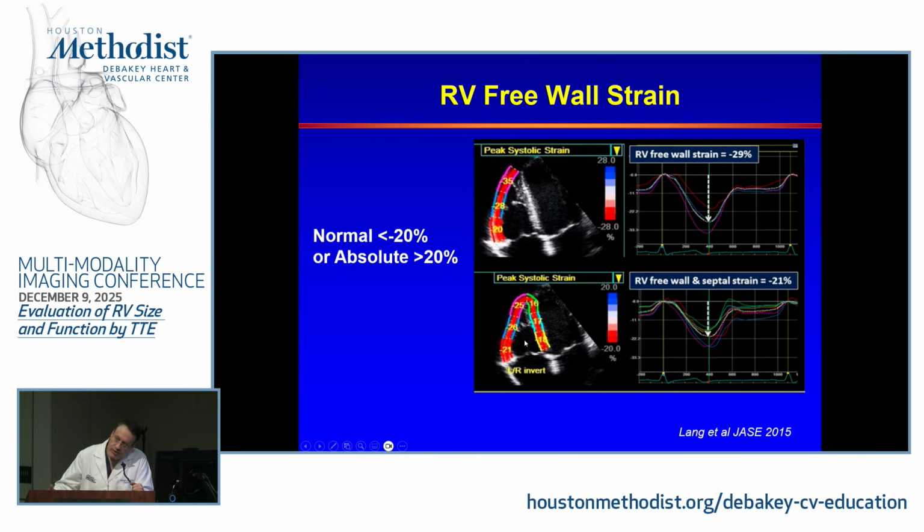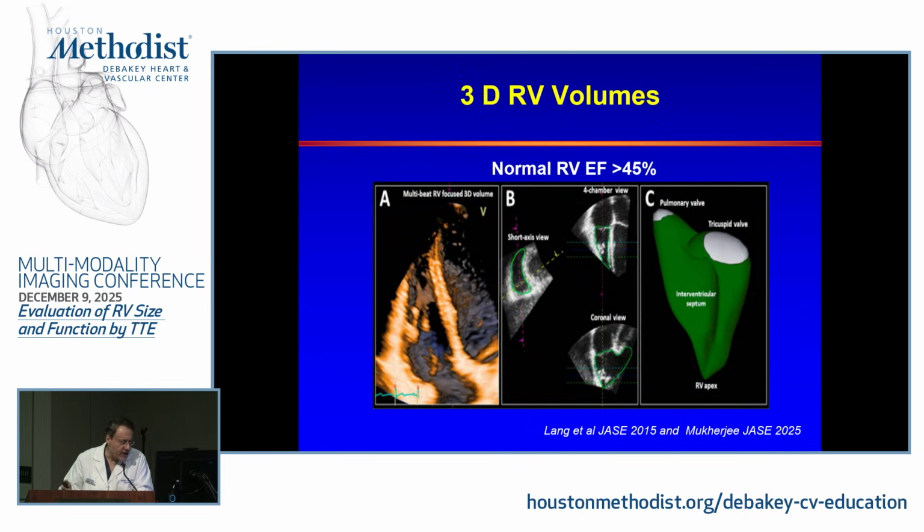The available ultrasound platforms will give you both, and will give you the TAPSE in the same set of data once the system is working on them, but the one we want to report is the RV free wall strain. There is a lot of data showing that RV free wall strain is associated with outcomes in many patient populations, but particularly in patients with pulmonary hypertension.